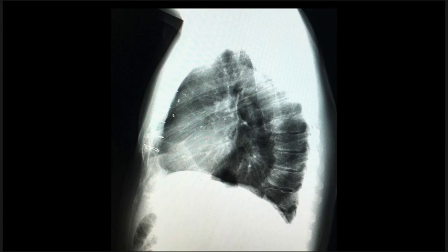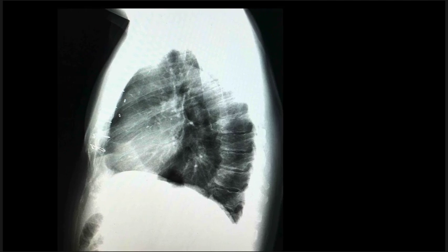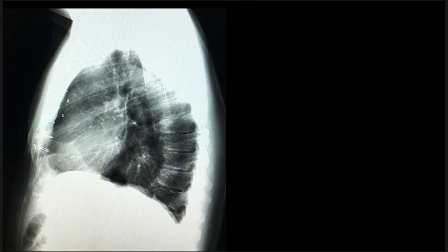Another issue is this thing here, the cardiac incisura. Remember that I made a big deal, and I mentioned again in this lecture, that the heart should have a homogeneous contour, but we do occasionally get this thing here. And remember that we mentioned that this can have a variety of appearances.